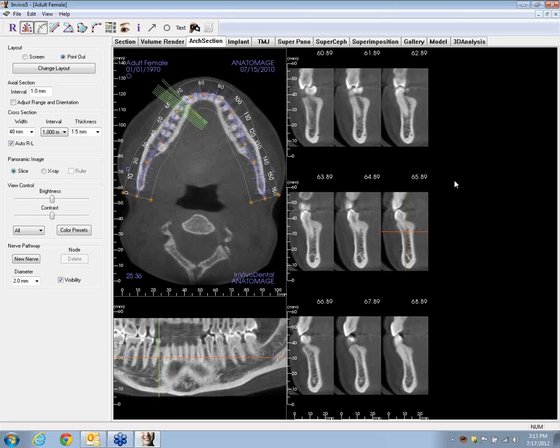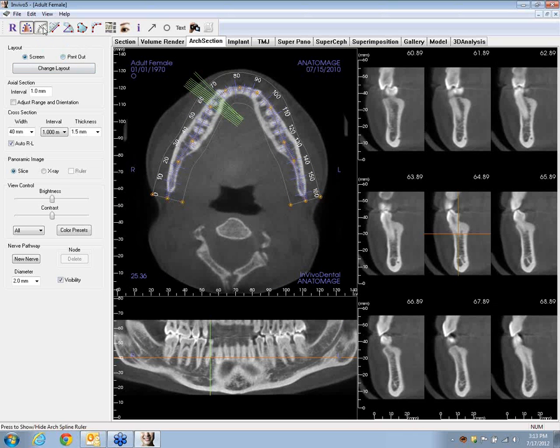All right, so this is the printout mode. It constrains everything that you've got on screen into 8.5 by 11 so that we can have this printed. You can see that each one of these cross-sectional views has a scale for width and height. All of the dimensions are there so that we can scale out and make this proportional when we're taking a look at our 8.5 by 11 printout. You get a meaningful scale from it. If the ruler is bugging you or distracting you, go ahead and turn it off.